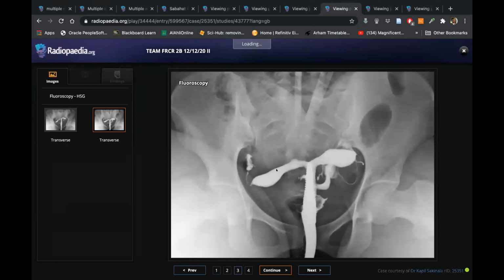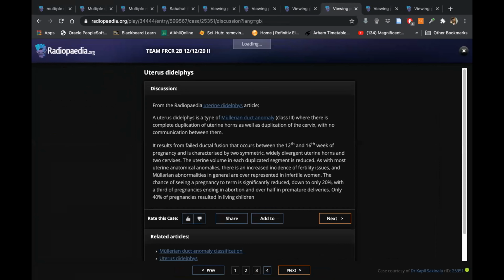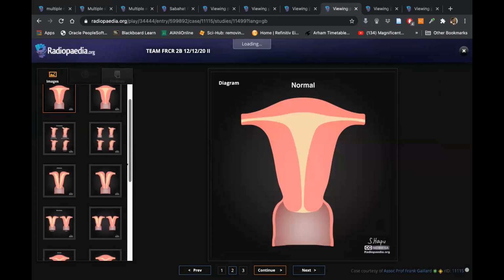It's a bit difficult here to comment whether this is double cervix or not, but they have given it as 2 endocervical canals. So that is why they have given it as uterus didelphys. But the way you were articulating, it's fine enough. You are saying that because I think it's a single cervical canal, so you were calling it bicornuate. I don't think any examiner would object; if he would say that there are 2, then you can go didelphys.